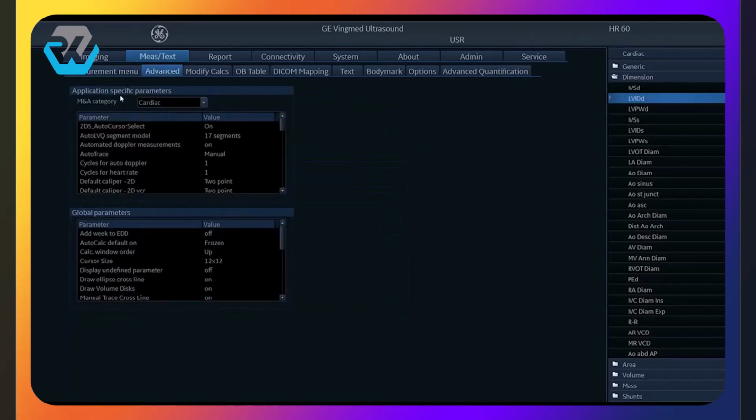And then in the box below where it says Application Specific Parameters, I need to scroll down the list until I find one that says Use Standardized Precision. I need to change it from being on to switching it off, and that means that I can then adjust the decimal places as I see fit. So I click and then from the drop down select off.